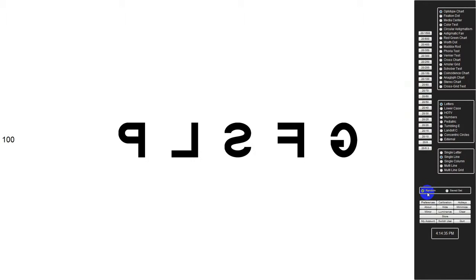They want to randomize it when you hit the next chart, or just hit OK on the remote control. We're really not going to go over the remote control functions here. This is mostly all software setup. So that's what that's for.